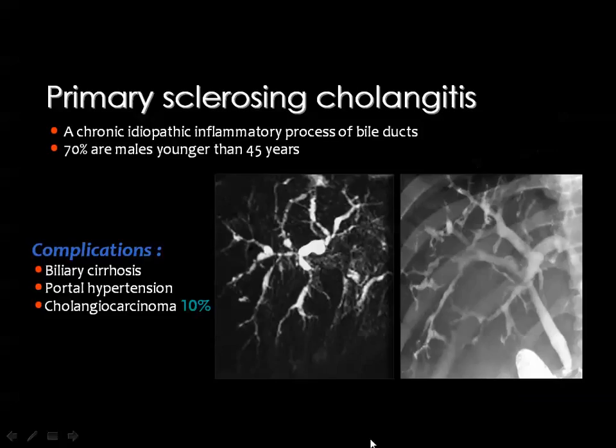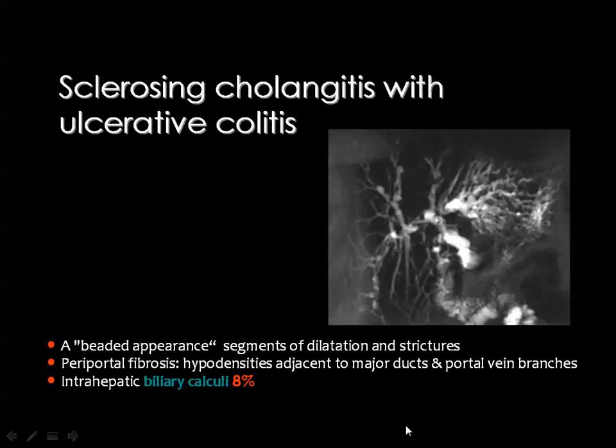diagnosis of pyogenic cholangitis. And if you see, as I have said, multiple biliary strictures and dilatations, you know that you are dealing with cholangitis. And if you see stones, you may prefer the diagnosis of pyogenic cholangitis, although sclerosing cholangitis may also be associated with some percentage of calculi.